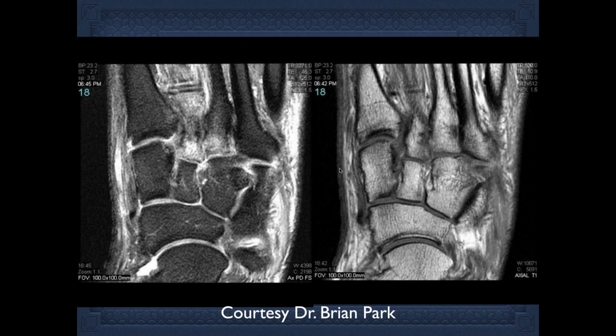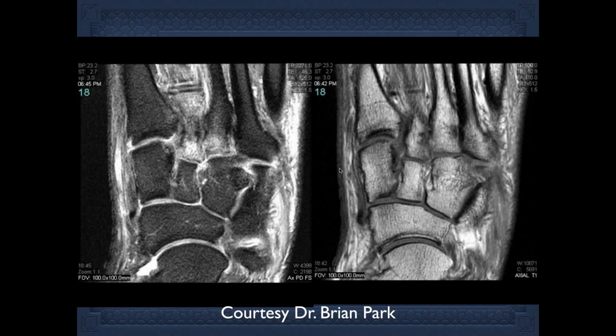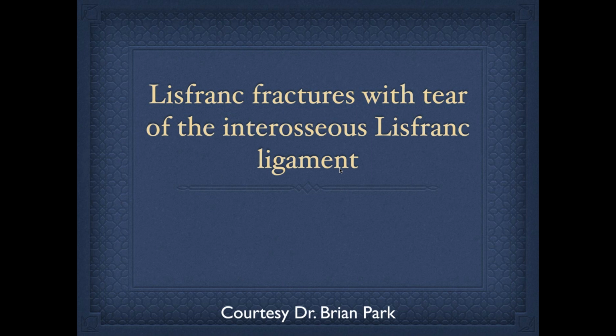That's some sclerosis too, isn't there, John? How old is this? This is a pretty recent injury. Well, it certainly looks like that on the second and third metatarsals. There's some sclerosis of the second one medially, but I'm just guessing on it.